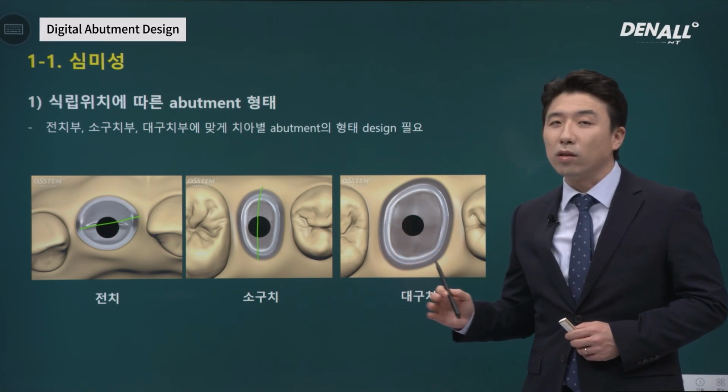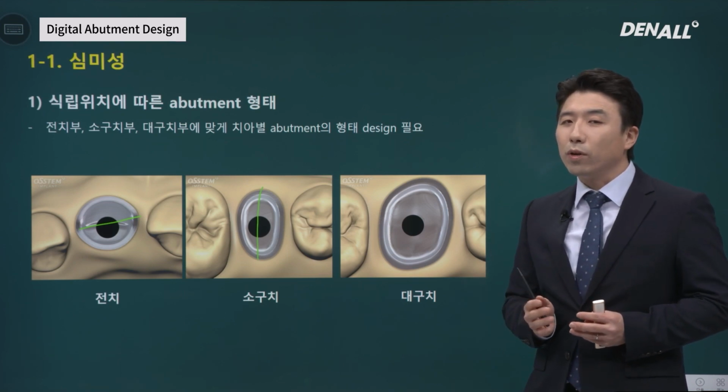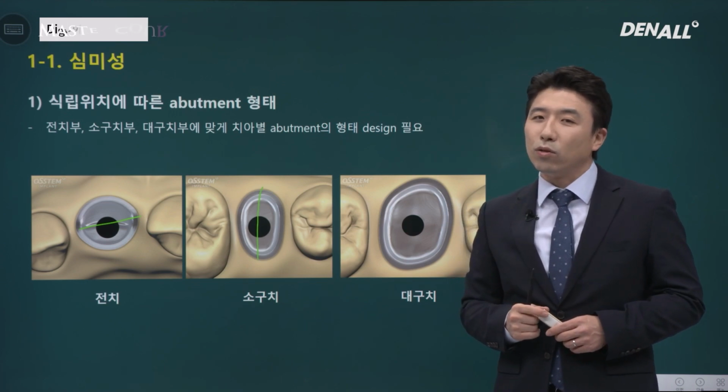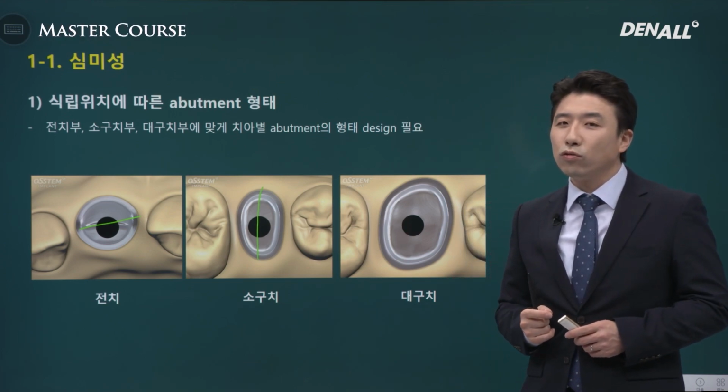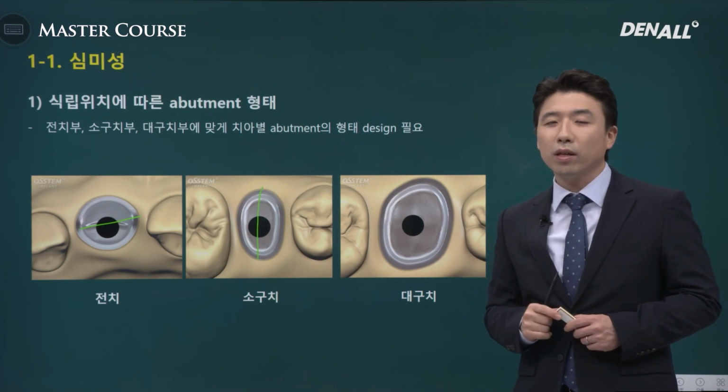for molar area. If you cannot form these profiles in the abutment, no matter how good a job you do on the crown, you will not be able to get the right contour. Abutment design is very important morphologically.